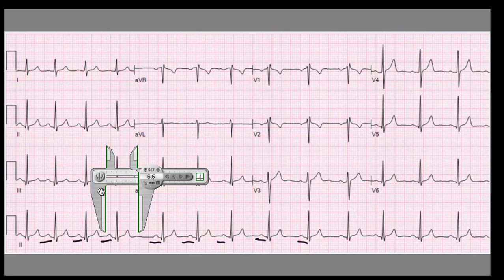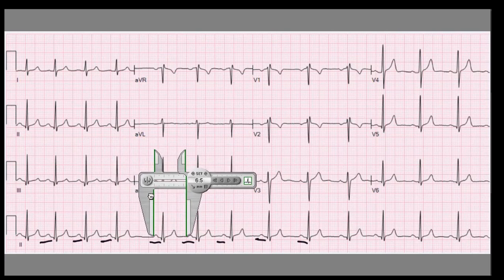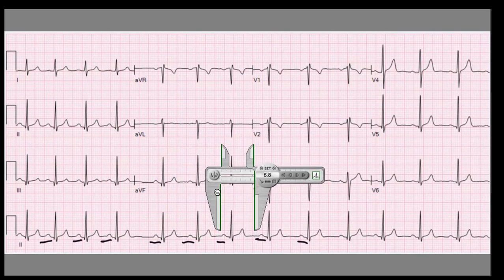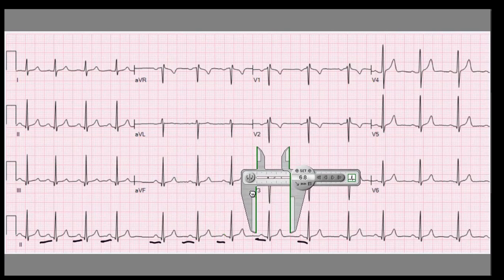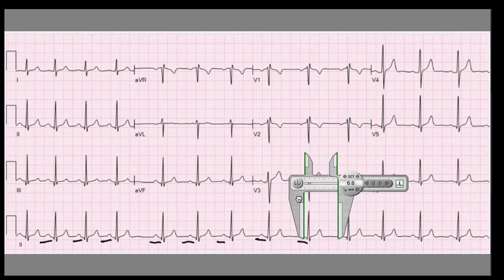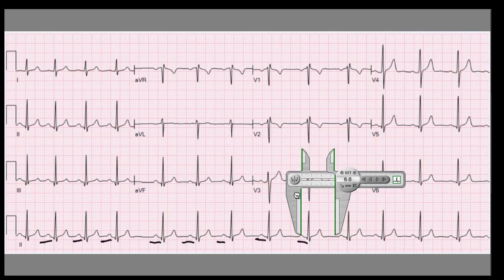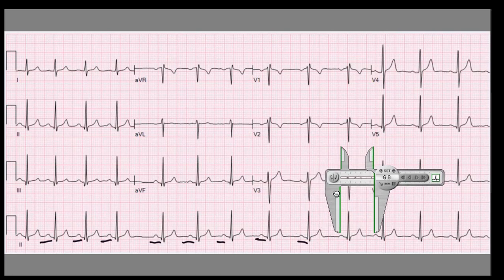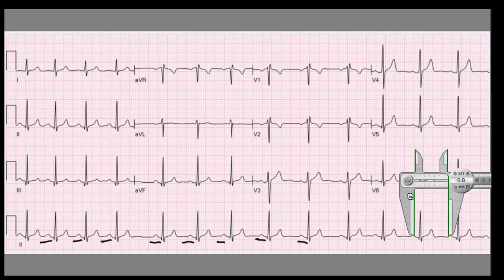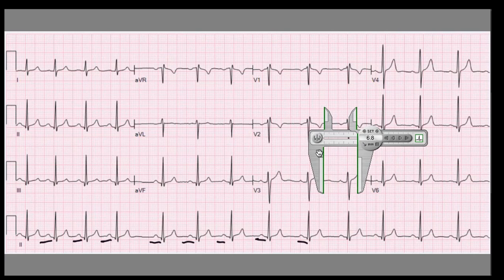But here let's see if the other P to P intervals are regular. Almost same, almost same, almost same. Here again it has deviated a bit because of respiration. A little bit of deviation. Similar again. Same interval again. So yeah, the P to P intervals are regular.